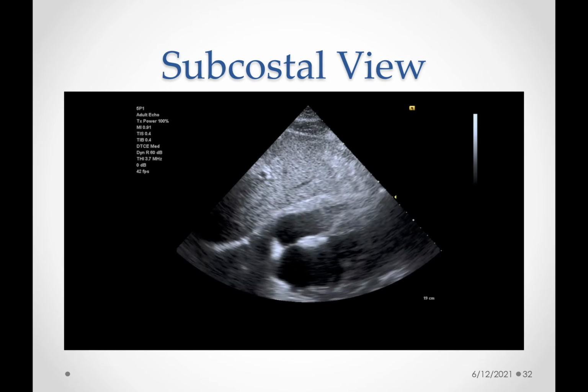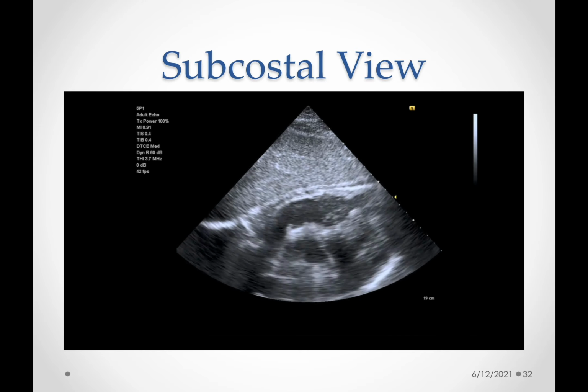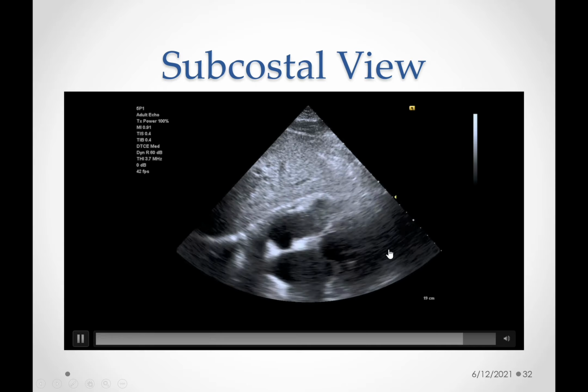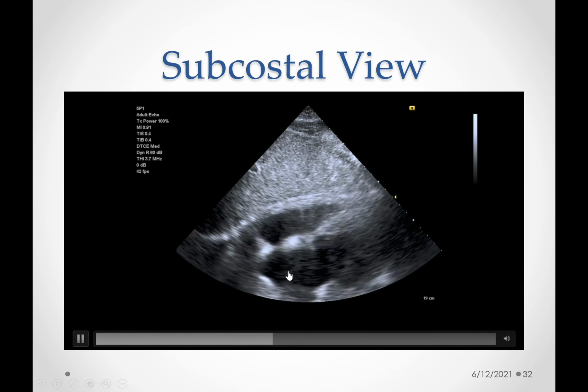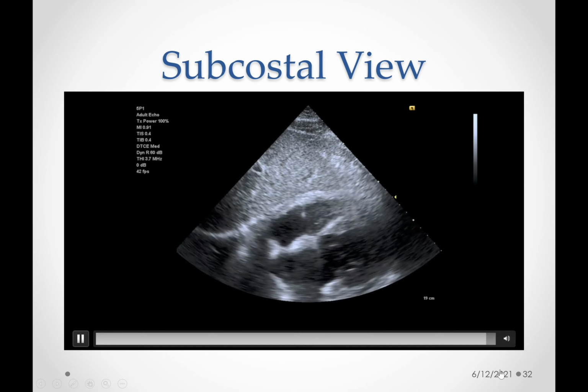Here you can see a video of a subcostal view. On the right side you've got the left ventricle, and on the left lower side you've got your left atrium, and then the right ventricle and right atrium is above them.